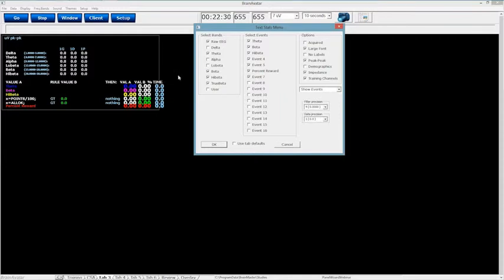So it is going to automatically put it in there, and if you've spent a very long time designing a panel and now all of a sudden all your different information is being added in there, you might get a little upset. So if you're adding new designs, I recommend checking off anything that's unused when it comes to event information. That way you don't have to worry about it later when you're maybe adding further to your protocol.